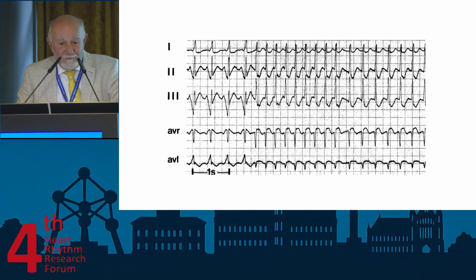Is that an inferior infarction with junctional accelerated rhythm? Is that atrial fibrillation in a patient with Wolff-Parkinson-White syndrome? Is that a patient where we are performing a radiofrequency ablation of the Wolff-Parkinson-White? Or is that Wolff-Parkinson-White with circus movement tachycardia and dual AV nodal pathways?